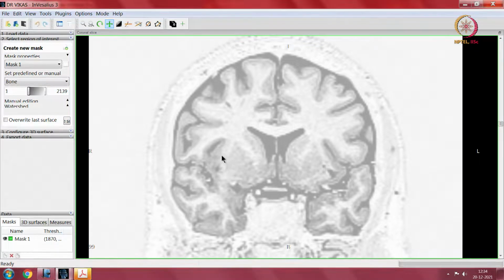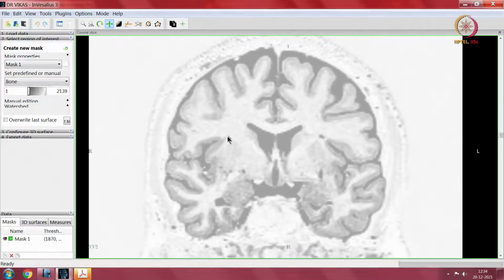Yeah. So, within the deeper parts of the brain, the deeper parts of the brain is this structure, this is the insular cortex. Temporal lobe, frontal lobe, and posteriorly this is the parietal lobe, temporal lobe, insula. So, that is how it is. So, this space here is the Sylvian fissure, this is the insula, and these would form the ventricles, lateral ventricles, this forms the third ventricle.